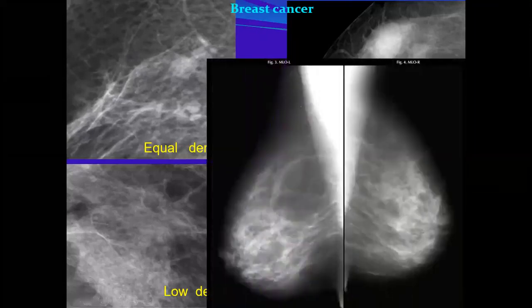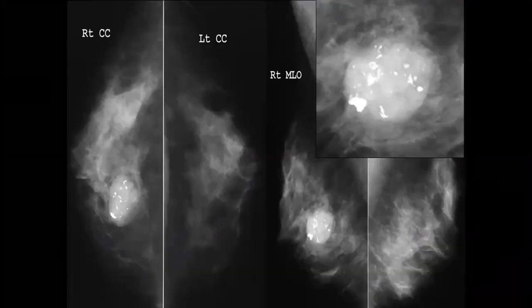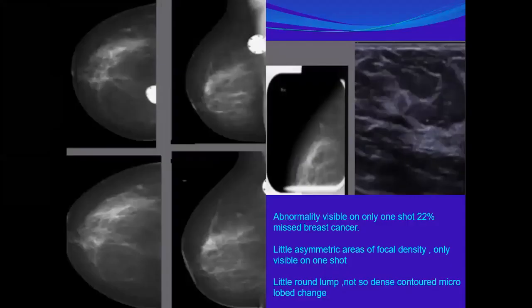And we said any fat containing mass representing BI-RADS 2 is typically a benign mass. Also describe the associated features, as in this case with skin thickening and trabecular thickening in a malignancy, as well as malignant type of calcification in an indistinct mass representing BI-RADS 5, compared with this typically benign, partially obscured mass with the popcorn calcification in case of involuted fibroadenomas.